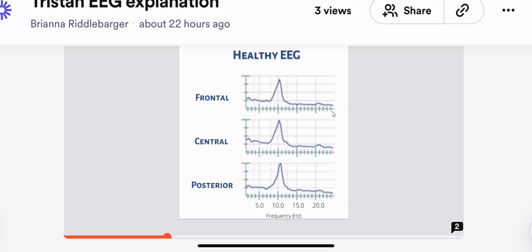And that's important for mental clarity, and it's also important for general stability. You don't want them to be all over the place. So it's kind of the happy medium. You don't want them too fast or too slow. You want this Goldilocks, calm, awake, and alpha waves are measured to basically help your body have a sense of reset during the stresses of the day, to help it stay calm and centered, to help it process information. You don't want it to be too fast. That can be associated with anxiety or hypervigilance. That would be if you saw peaks happening over here in this region. You don't want it to be too slow either, where it's below 9, because then that's more associated with being sleepy, more sluggish, less rational, etc.